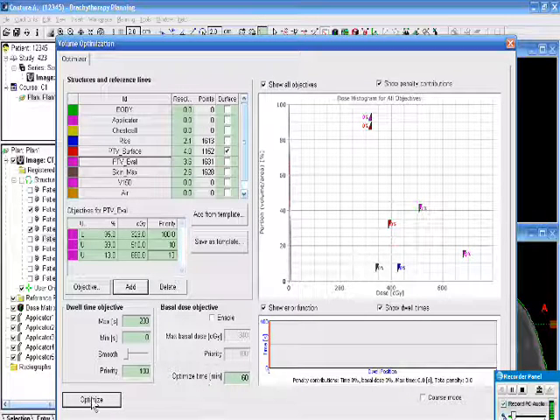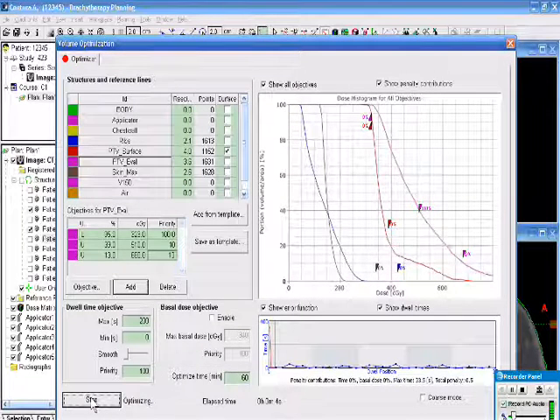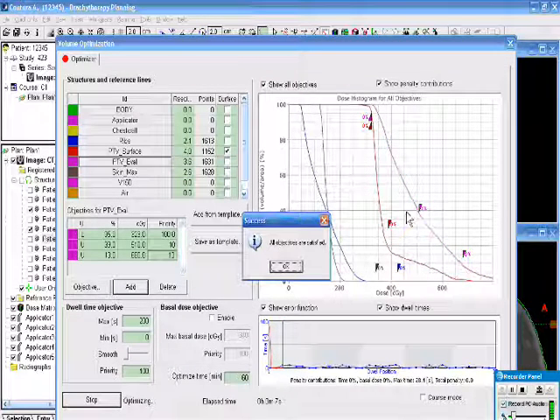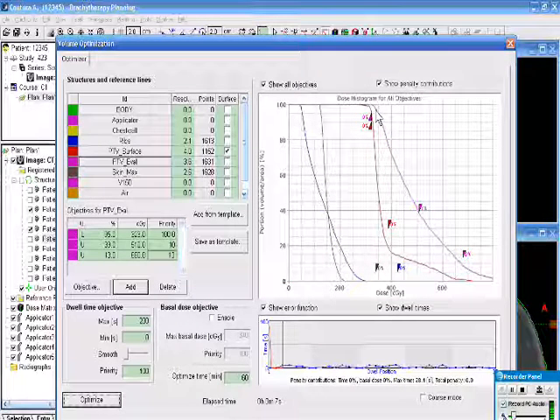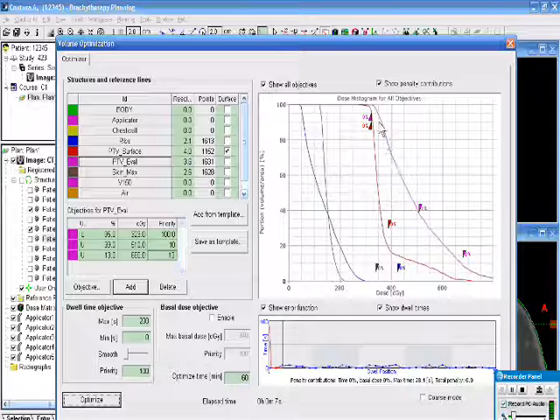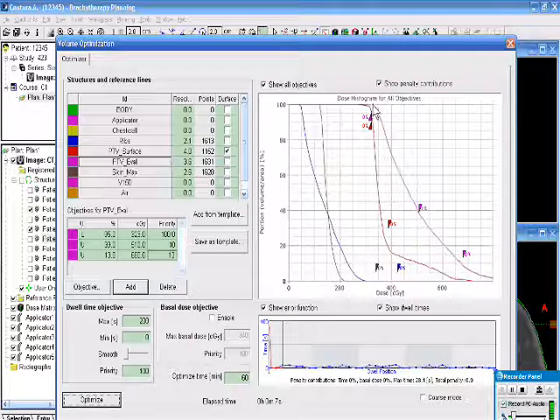So we're about ready to roll here with the optimization. Let's see what happens. And you can see it moves pretty quickly to something that's reasonable. We're violating our V150 here a little bit. It managed to grab that one. And you can see this is our DVH for the PTV eval, and you can see we have almost all the volume there treated to that dose. I said this is an easy case. So I would say that we're probably over-treating the doses here by sacrificing some of that.